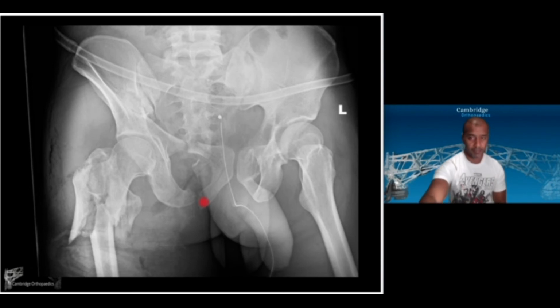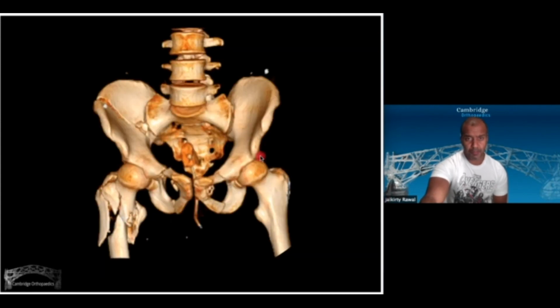Okay? Now, windswept deformities, think an LC3. And it kind of makes sense. This SI joint looks wide, even though it's not a proper view. And if you square up the pelvis, more features are revealed, but the spine's pointing the wrong way now. And we got this here, it's a crescent. Maybe an anterior column fracture, but I'm going to call it a crescent, okay? It comes into the SI joint, and this SI joint looks wide, and we got these bilateral rami fractures, which I wonder how these really fare.